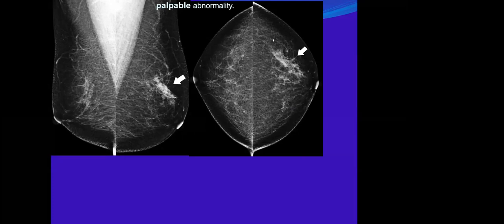So it is global asymmetry. And on these images, I couldn't see any associated feature, no skin thickening, no calcification, no axillary lymph node enlargement. But you did not say no distortion. There is architectural distortion. Yeah, subtle distortion is there.